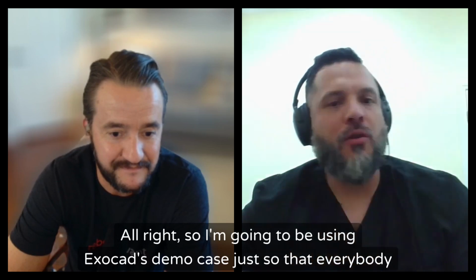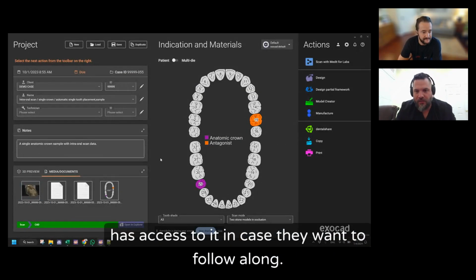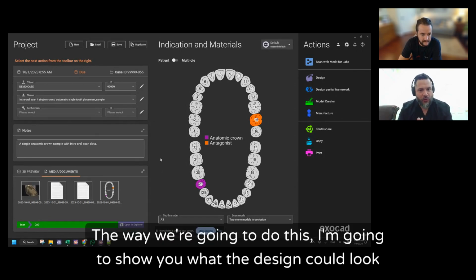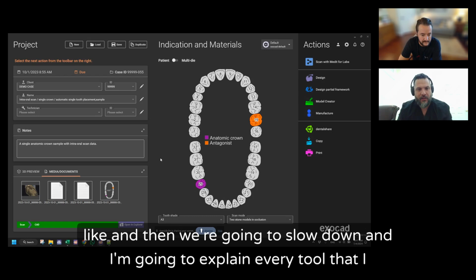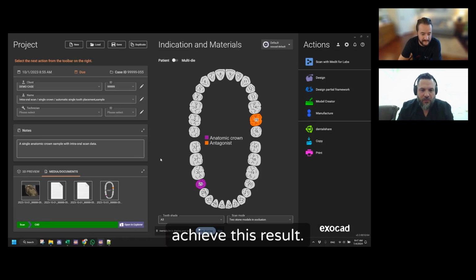Excellent. All right. So I'm going to be using exocad's demo case just so that everybody has access to it in case they want to follow along. The way we're going to do this, I'm going to show you what the design could look like, and then we're going to slow down and I'm going to explain every tool that I used and the logic, at least in my head, as to how to utilize the software to achieve this result.